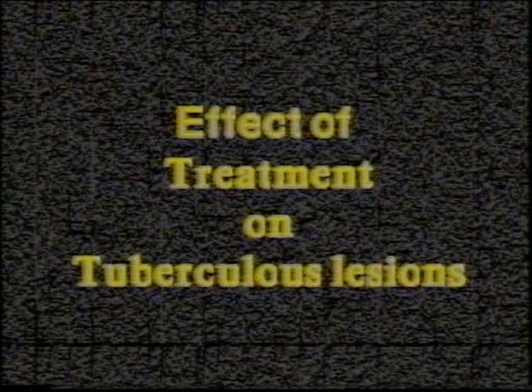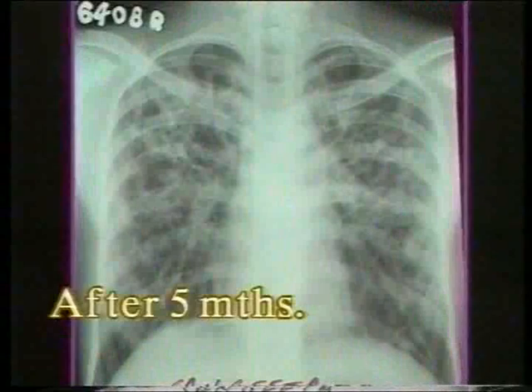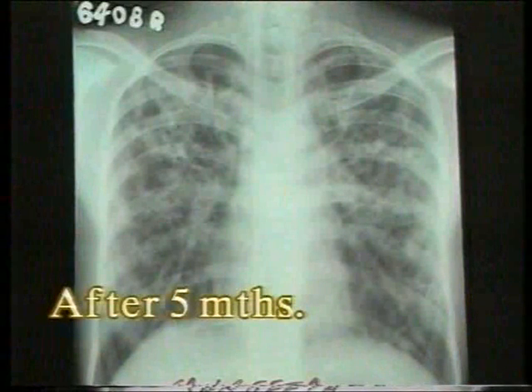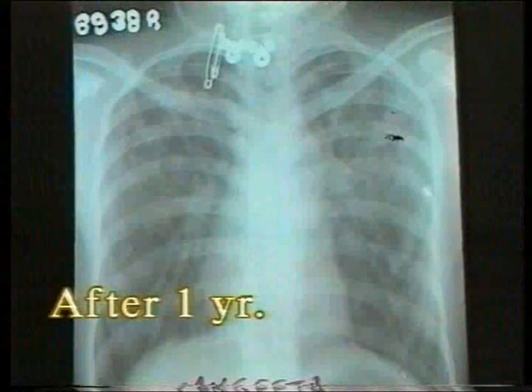Now before we move to the pleural lesions, let us see some tuberculous lesions and the effect of treatment on them. This is the first X-ray before starting chemotherapy, showing extensive lesions involving both the lungs. Note the fluffy appearance of infiltration. This is the second X-ray after 5 months. Now the lesions are more sharply defined and fibrotic, and infiltration shadows have reduced. And the last X-ray after 1 year of chemotherapy shows complete healing with minimal residual fibrosis.